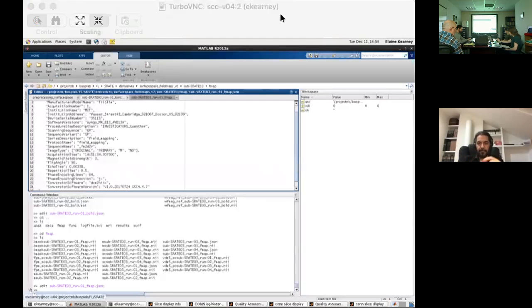I would say even before you look into a single other thing, just rerun these. And we'll look again and see if it looks better, because with the field maps, the alignment should be better. If it's worse, something's not right.